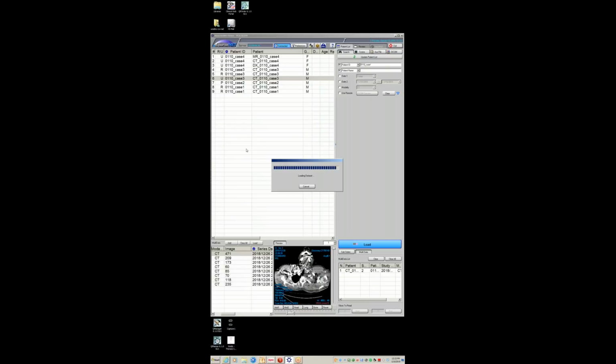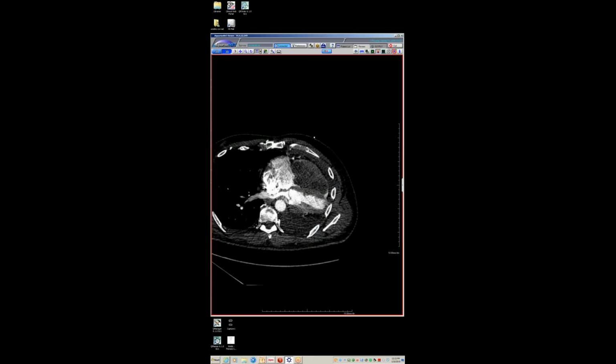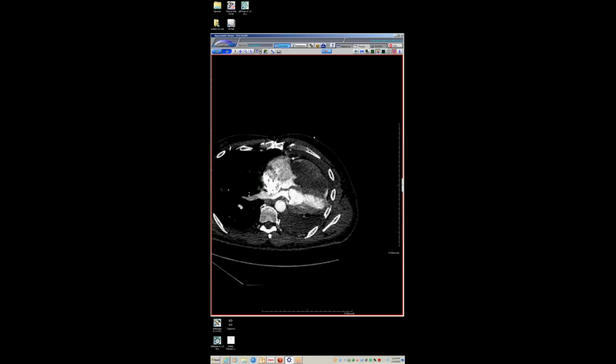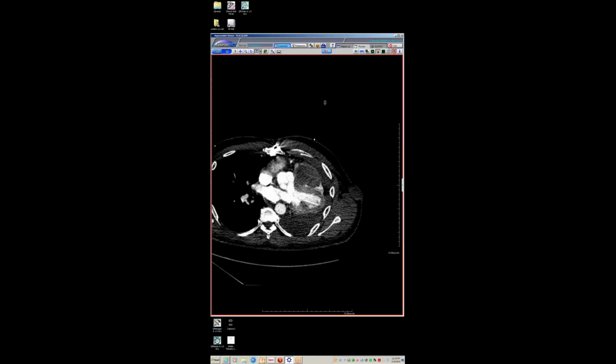I don't even know how this guy actually walked into the hospital or got to the hospital. But yeah, I don't understand how this is compatible with existence. But he somehow walked into the hospital and got this exam and was sent to hospice after this.